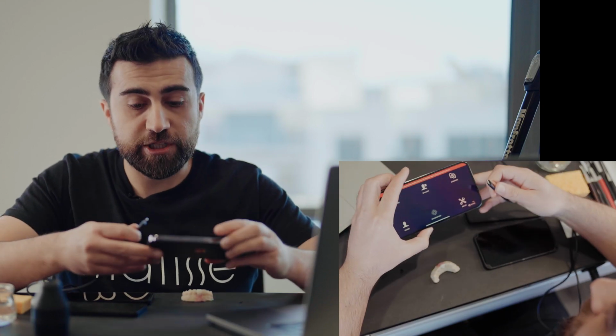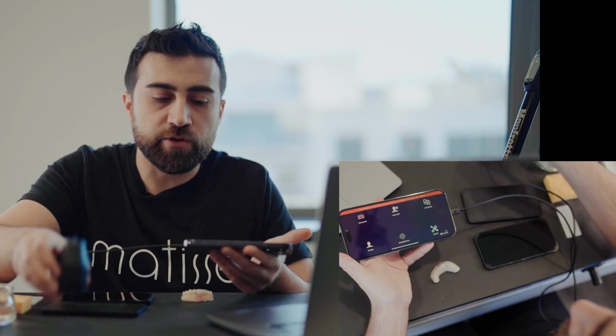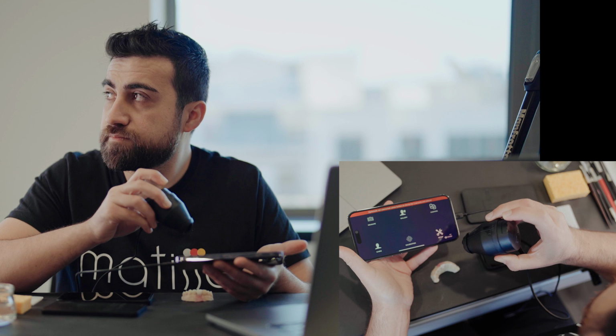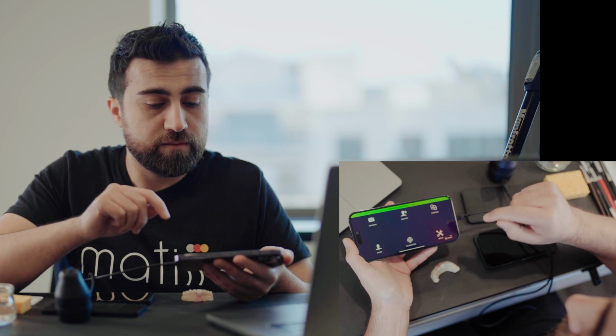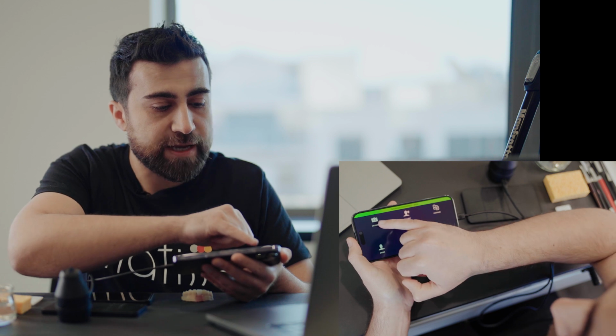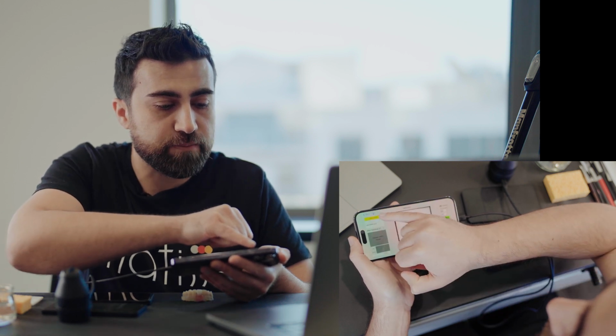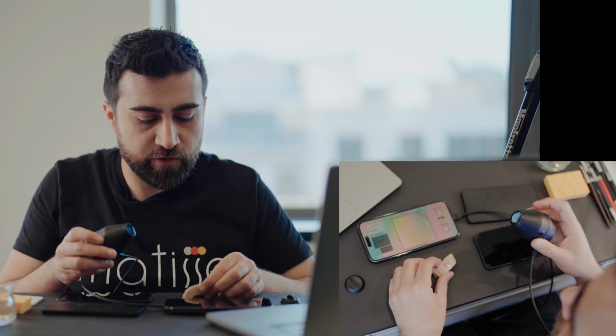Okay, so now let's switch on Optishade and connect to your phone. Then click on the button for 3 seconds and release. Okay, Optishade is already switched on. Now we go to measure and select the patient here. Click on unnamed and then select the right patient. Now we'll take an image of the crown on the aesthetic model.